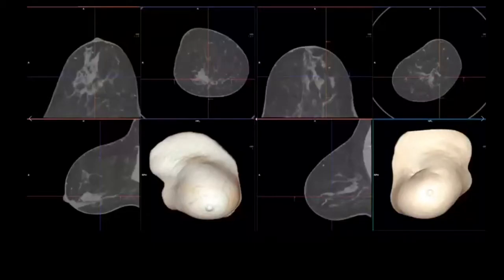So hello everybody. Today I want to show you the famous imaging with the MAMA CT. This is senological imaging of the next generation. You have to remember these images are done without any compression in less than 12-second scanning time per breast. The whole examination is done with intravenous contrast in less than 5 minutes.